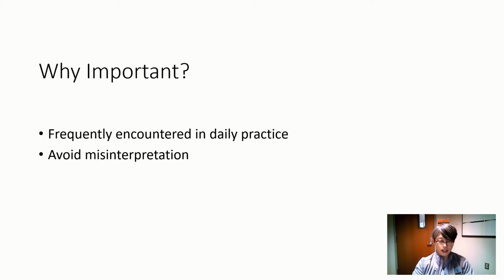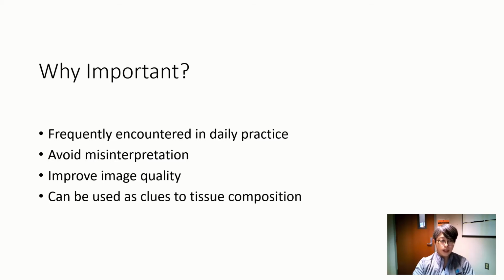That's why it's important to understand how they look. We can also apply the knowledge to minimize artifacts and improve image quality, and it can be used as a clue to detect what the tissue looks like or its composition.